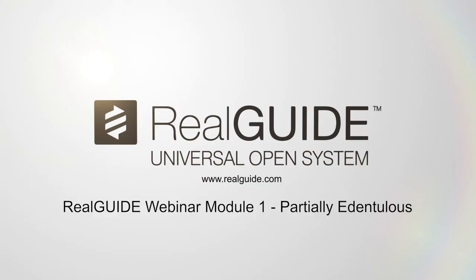And we're going to be going through the RealGUIDE software today as kind of an introductory module, demonstrating the different tools involved in working up a case and actually going through those steps for a partially edentulous case.